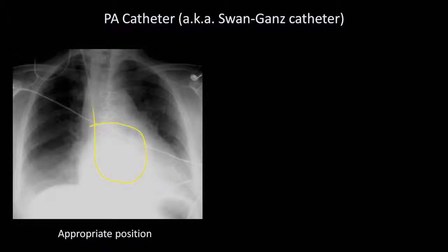The catheter will typically come down from either the right IJ or left subclavian, make a counterclockwise 270-degree turn within the cardiac silhouette from the viewpoint of the observer, and end at the level of the hilum, no more than a few centimeters right of midline.